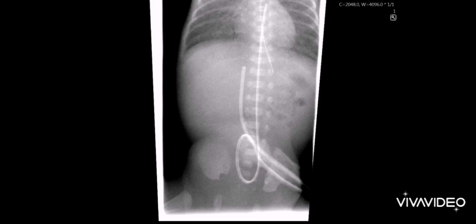So when we're talking about that, we're talking about the thoracic vertebrae. And those are the vertebrae that our ribs are attached to. So there are 12 of them. And the way to count them is to count down from the ribs at the top. So find the first rib and count all the way down. We assume that most people have 12 ribs, but we can't take that for certain, so we should check. So count down, find number 12, and then the 12th and the 11th rib attach directly to their corresponding vertebrae, whereas the others sort of float between. So that's where we count down first.